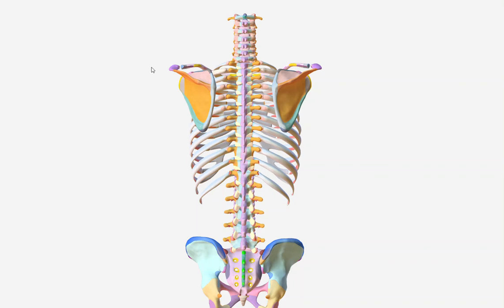And then I wanted to show you some rotation, how rotation would look on a chest x-ray and on an abdomen x-ray. So right now, the way that we're looking at the patient is we're looking at their spine. So we're looking at their back. So let's just imagine that the whiteboard that the patient is facing is, say, the bucky or the table where the patient is. Either they're standing at the upright bucky or facing the upright bucky, or they're laying face down on the table, and we are looking at their spine. We're looking at them from their back.